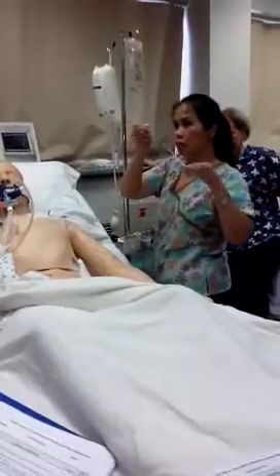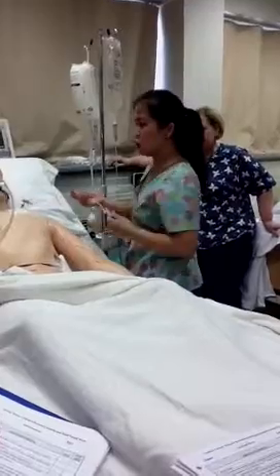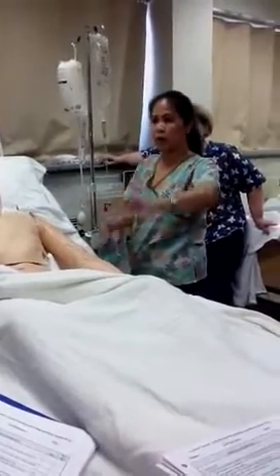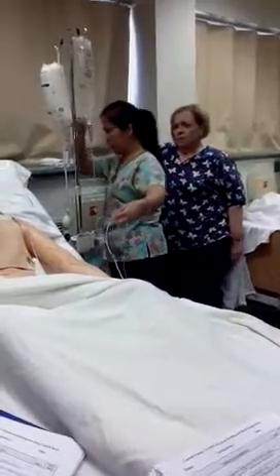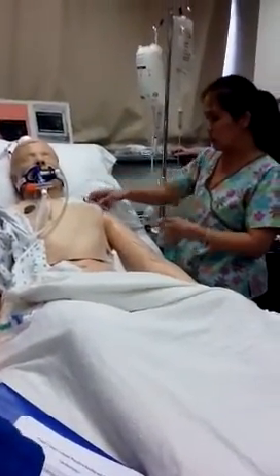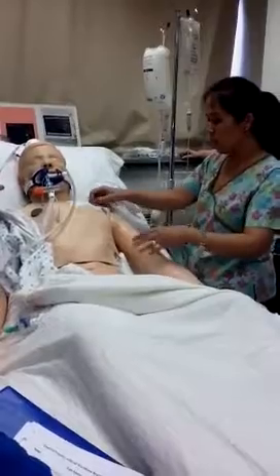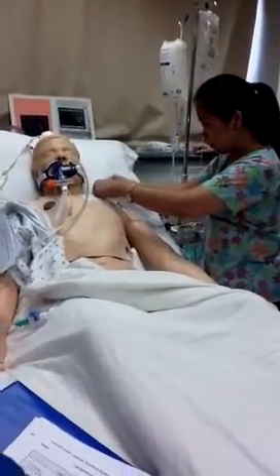It is the same kind, because you want this to be the hard part here. So there's a triple lumen. I guess you will not use the same one, okay? Because there's another gadget. This goes with the art line. This is what you would use for the art line. But let's say a central line: triple lumen, because there's three lumens, basically, right? Double, single lumen. And it will tell you here there's a proximal, distal, medial.